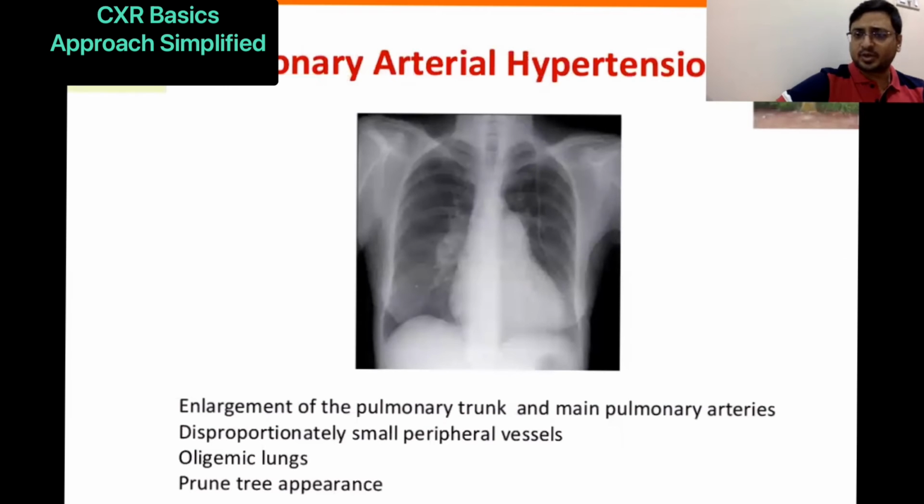And coming to another aspect, pulmonary artery branches or vein branches can be visible in different disorders. You can easily diagnose these conditions by the lack of the normal bronchovascular markings. It can be pulmonary oligemia, where less blood flows, in cases of some congenital heart disease, whereas it may be pulmonary plethora, where more blood flows, in cases of heart failure. So these are the different kinds of scenarios that look different in chest X-ray. Sometimes it's very plethoric, sometimes it's oligemic.